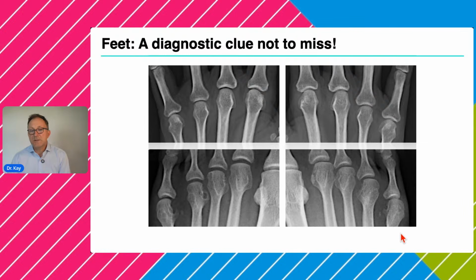And actually, this is already bringing us to the topic of today's session. Here you need to compare the normal contours of these bones, and you need to know these contours in order to make the right decision. Here the MTP head of the second ray is nice and clear.